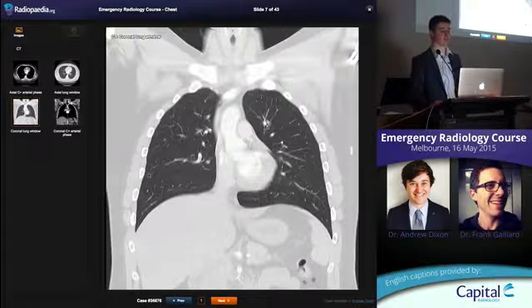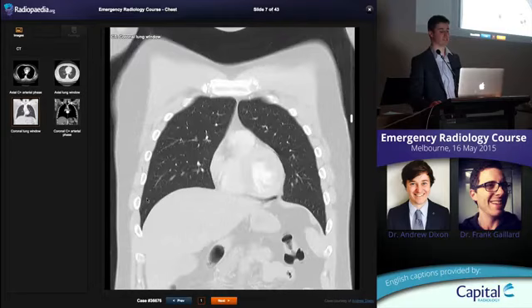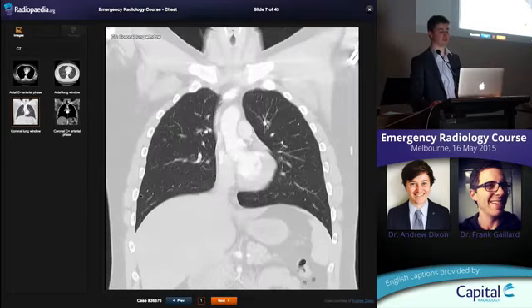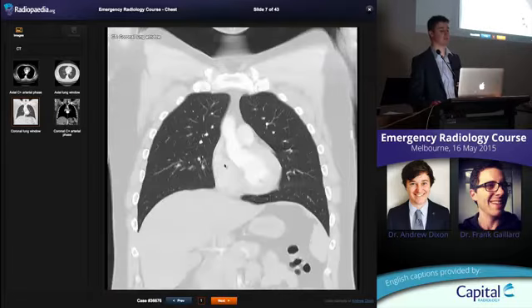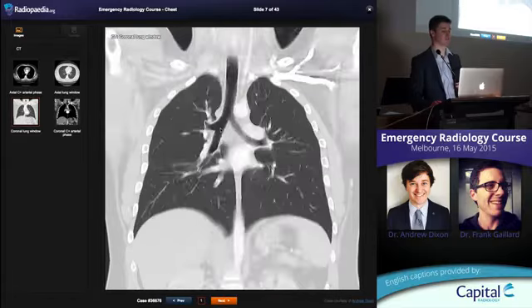Right middle lobe, same thing. Horizontal fissure here, oblique fissure coming through. This is all middle lobe touching the right heart border. So all of the right heart border is due to the right middle lobe. But you can see the fissure comes across here, right? And all that hemidiaphragm is in the lower lobe. Okay? So lower lobe, you're going to lose the hemidiaphragm. Middle lobe, you're going to lose the right heart border. Upper lobe, you're mainly going to lose that interface with the upper mediastinum.